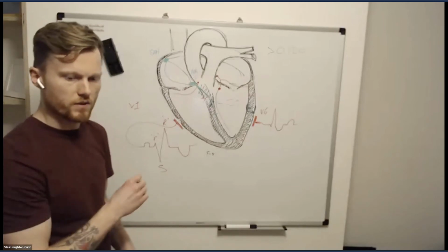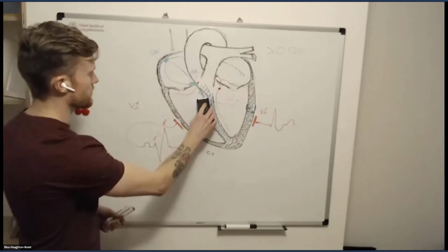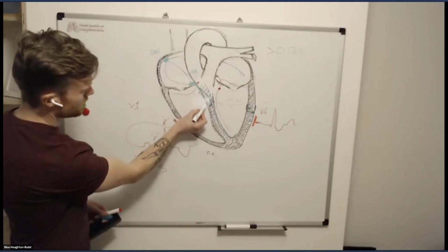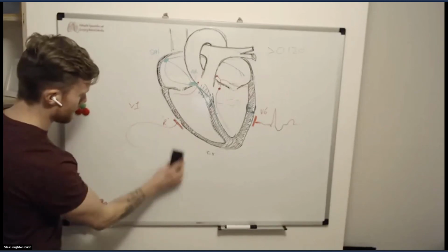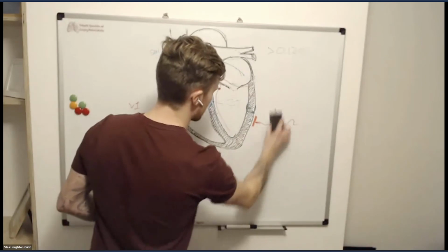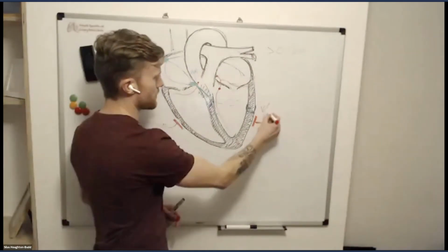I'll let everyone have a look at that, screenshot it if you want to, and then I'm going to rub that out and we'll have the same discussion about the left bundle. All right. So that's right bundle branch block.